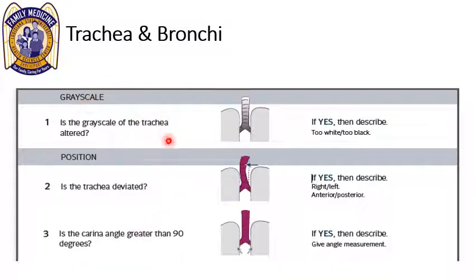So the trachea and bronchi, obviously the normal, you see in the middle, you see with your mind's eye, and it takes a special amount of time, if you're not familiar with looking at chest x-rays, to be able to differentiate the subtle hues of gray, which sounds silly. But if you do that and you are able to see the carina in your mind's eye, it takes a moment. You just got to look at it, and you have to not focus, you have to defocus, and then you can see the subtle objects.